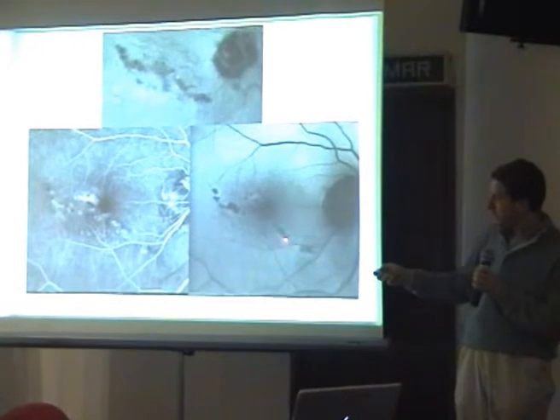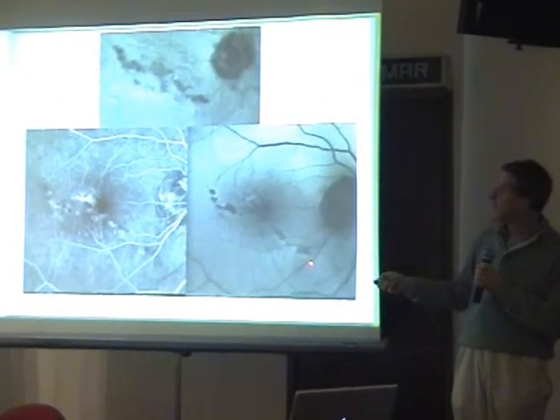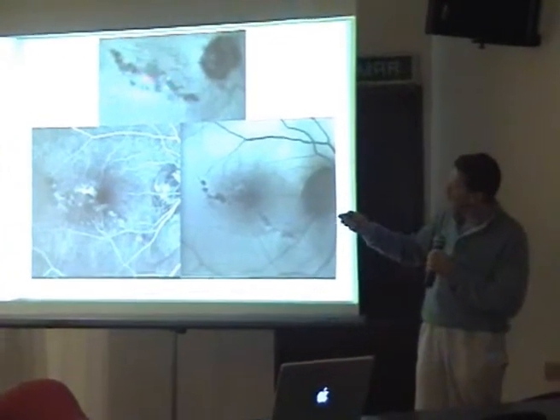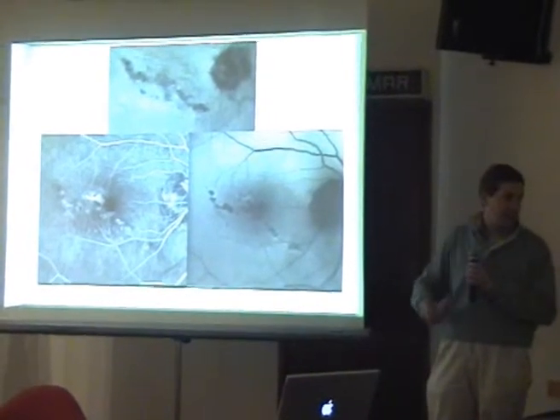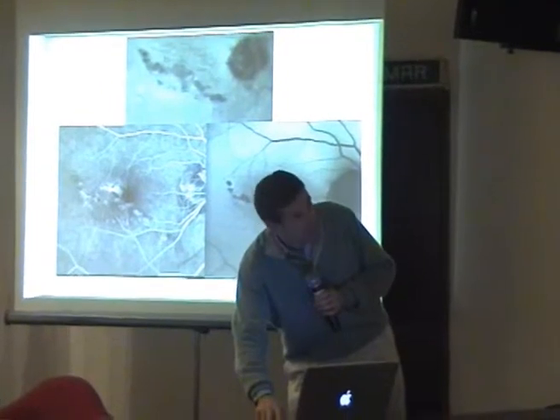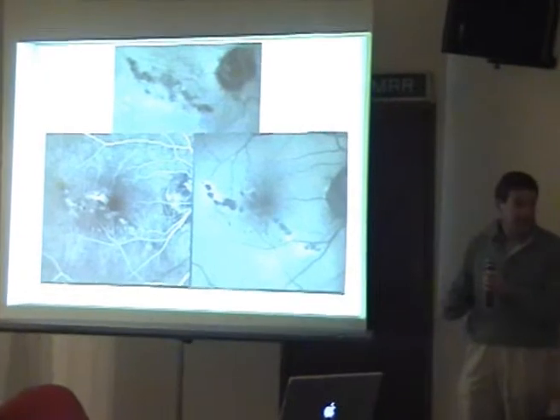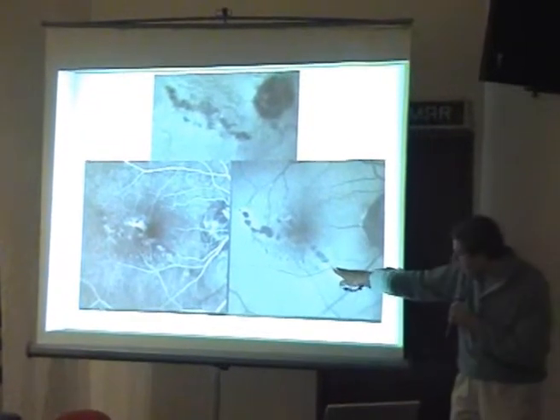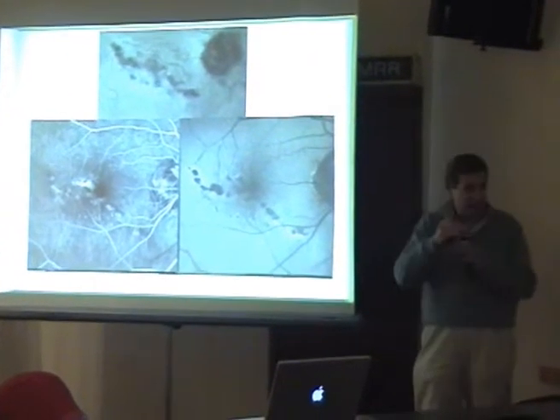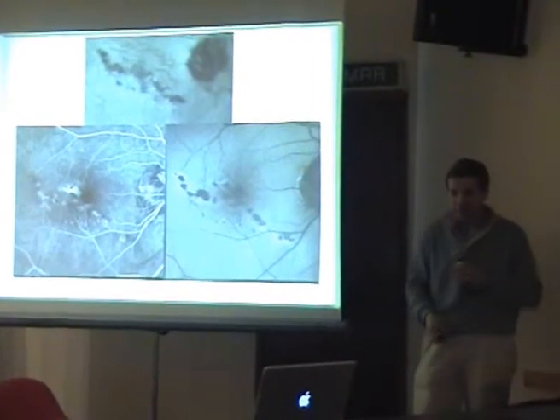But you see some changes, some atrophy here that corresponds exactly to the sick choriocapillaris that we saw before any injection. And 1 week later, that was the situation, still increasing. And you see there is an increased autofluorescent area here that probably predicts an increase of atrophy there also.